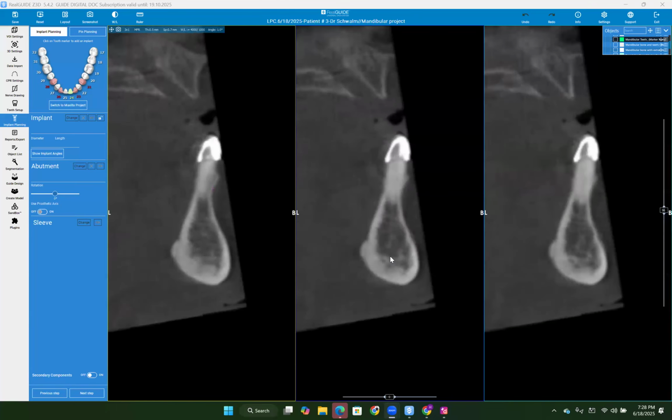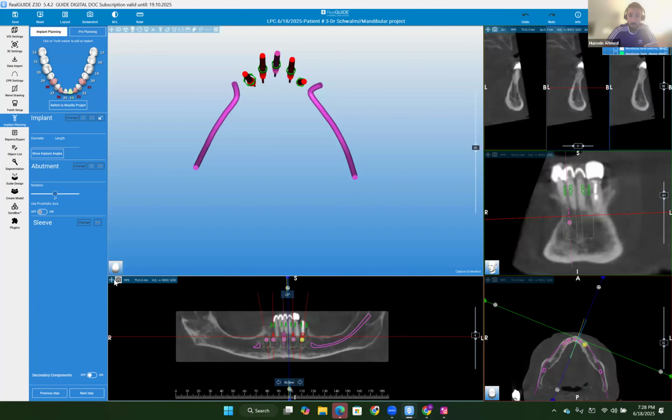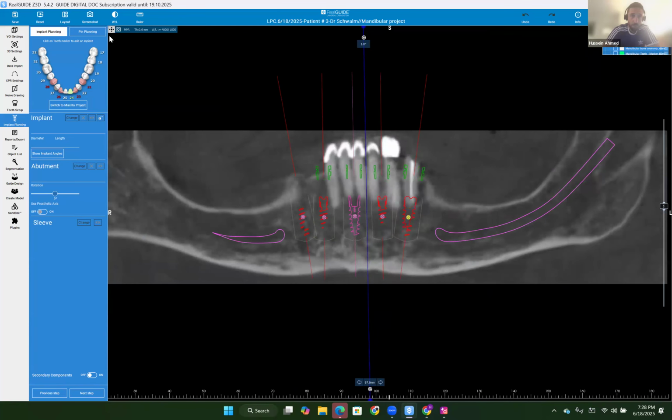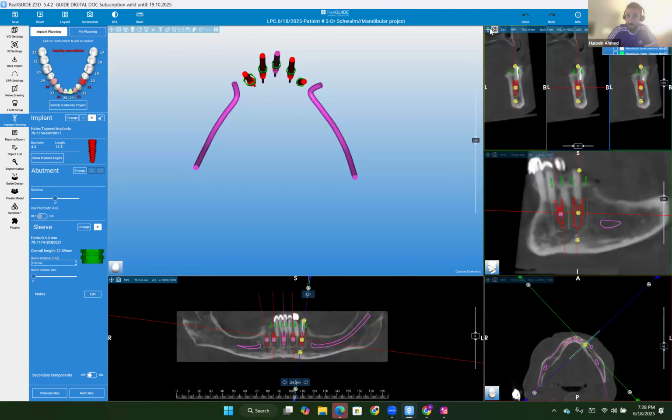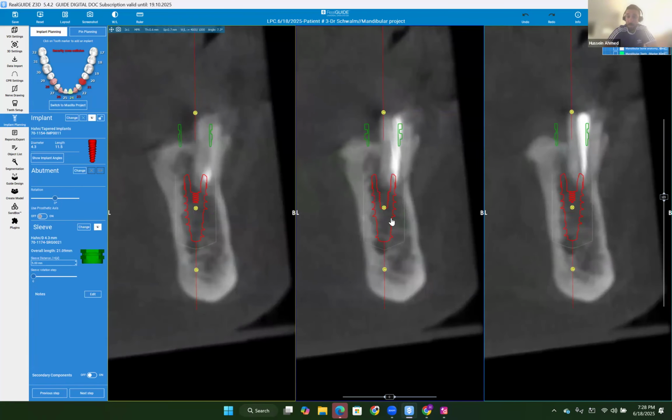Okay. So you want to start planning the implants here? Right away. Here we go. I went a little bit wild with this one, Dr. Resnick. I went with the A, B, C, D, E position just to establish that. Exactly, sir. Let me start by showing you the E position. For the E position, I have a 4.3 by 11.5 millimeter long implant.